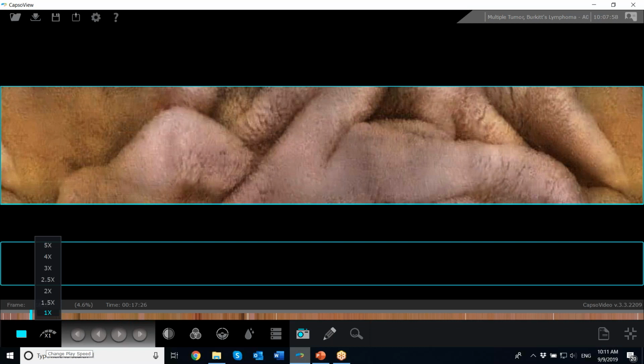So panoramic view displays one frame from each camera. So basically this is camera 1, camera 2, camera 3, camera 4. That's how it's stuck together and created this panoramic view. And the dual view will show you 2 frames from each camera.